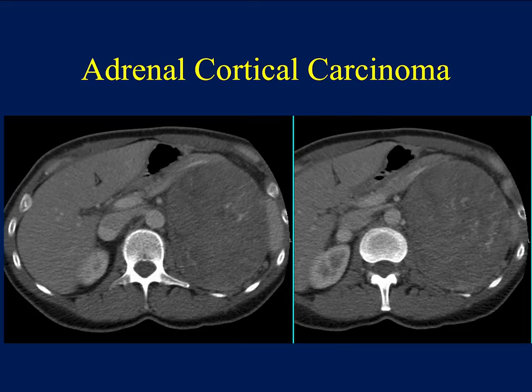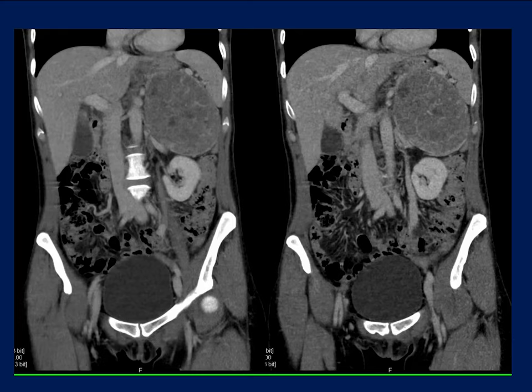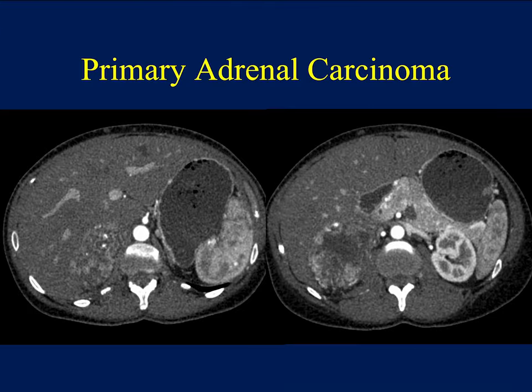Another one on the left side. Not very vascular, but there's some vascularity. It's large. You can see some necrosis, but again, the size is what drives me. Now, could this be something else? Well, if the patient had hepatoma, I could think about metastatic hepatoma or even melanoma. Both of them give large, relatively hypovascular metastasis at times.